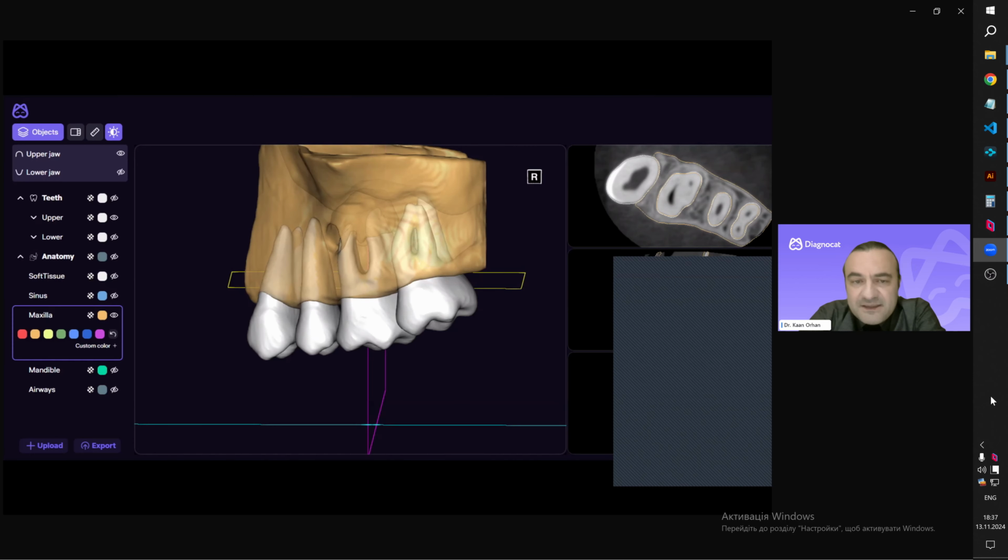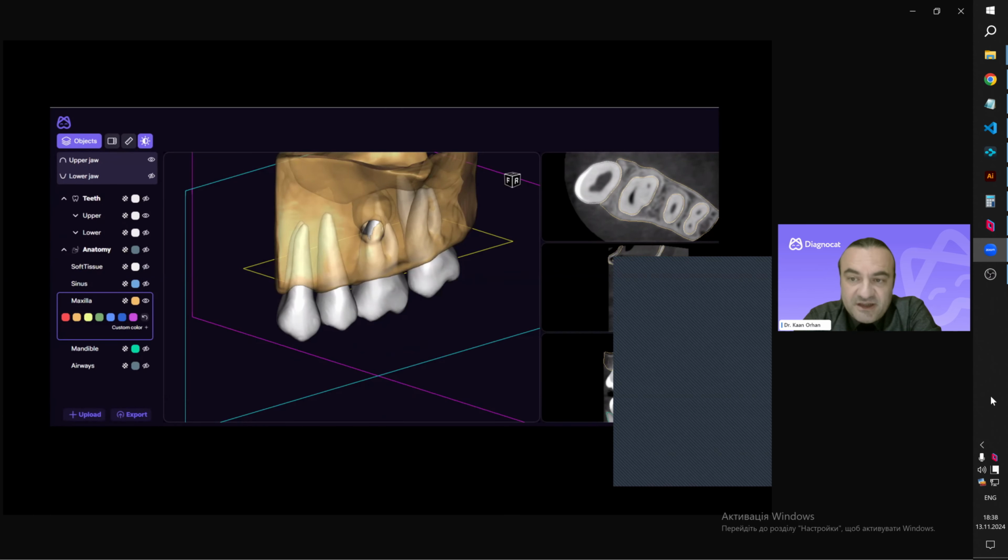See how nicely the 3D segmentations were done due to the periapical pathology. At C, there is a huge dehiscence and also opening of the maxillary sinus. It is quite challenging when you are looking at the 3D volume, especially if you are not oriented, you can miss these types of fenestration and also the relationship of the openings of the maxillary sinus due to the periapical pathology. But right now, we have this option to visualize everything.